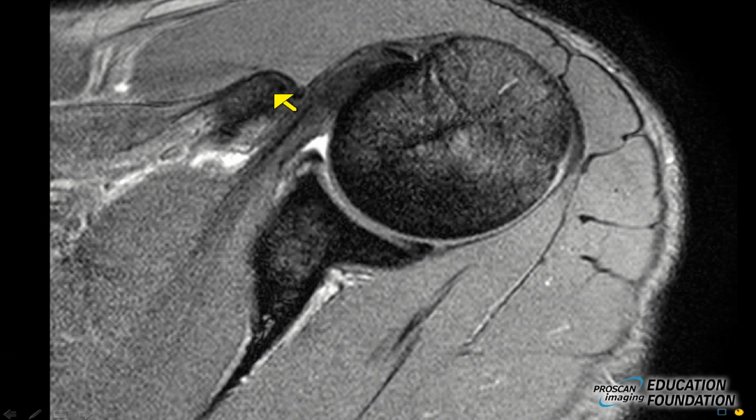We still have the very bottom of the coracoid, and yet the labrum is now not snug as a bug in a rug on the adjacent glenoid. There's a big hole here. You could drive a small Buick through there. Are we low enough? Well, maybe, maybe not. So let's keep going a little lower. But in the back, the posterior labrum is opposed. It's closed down. This is what we want to see anteriorly on the next slice.